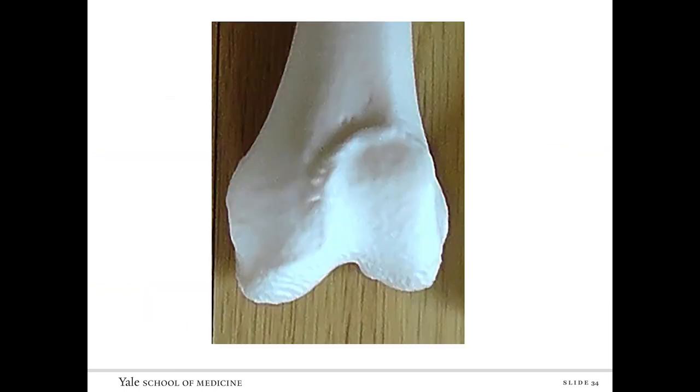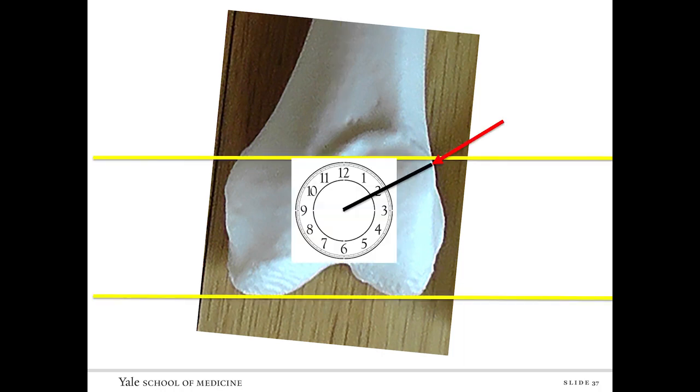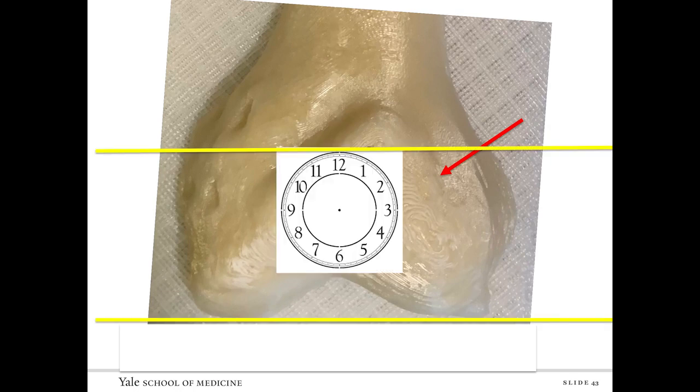Here's a more dysplastic femur, centered, framed, clock face applied, a 2 o'clock left femur. And the most dysplastic distal femur we represent, centered, entry point applied, framework applied, clock face applied, entry point represented at 2:30. The clock face and the medial angle are 2 good tools for describing trochlear dysplasia.